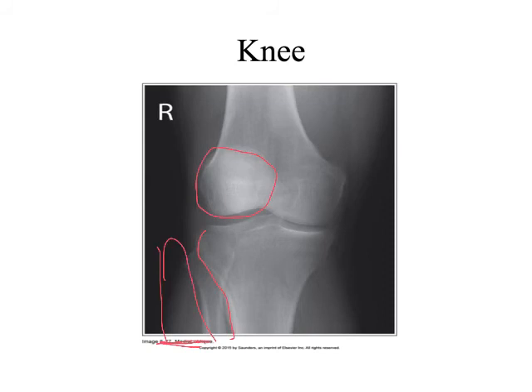And also the joint space is more closed medially, so that would make it medial. And if it was lateral, wouldn't the fibula be more behind the tibia? Yeah. I'm sorry, it is oblique. It's medial. The print on the bottom says it's medial, but I've learned that this textbook is not always accurate, so I'm just trying to unpack it some in my mind.